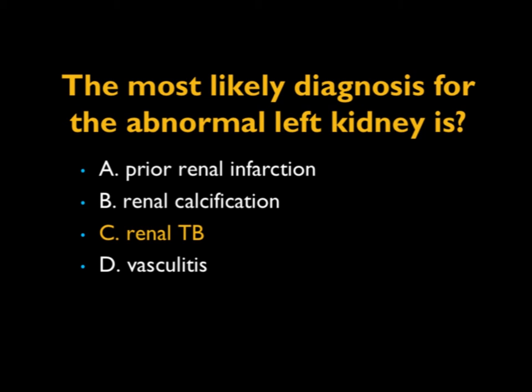Calcifications of the cortex, some medulla, small kidney, poorly functioning renal TB. We see renal TB very infrequently, but it's something that should be kept in mind, particularly when we see patients from foreign countries.